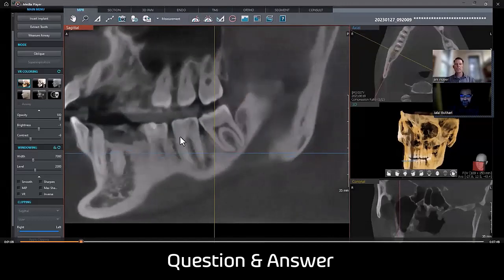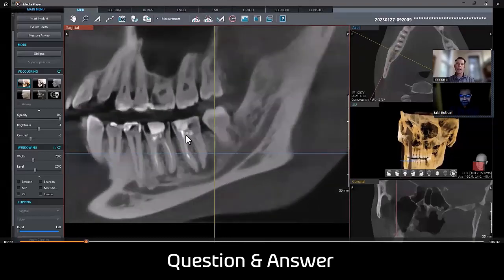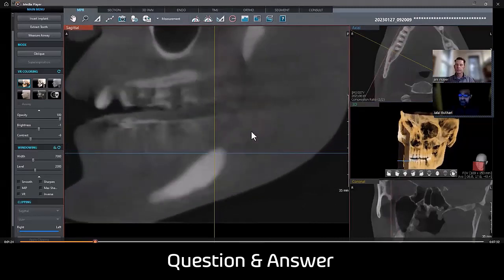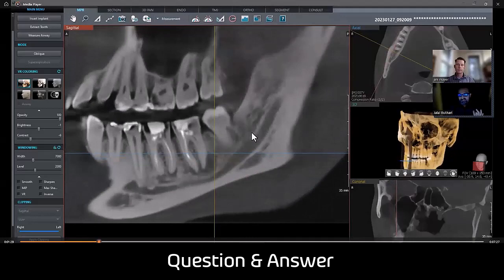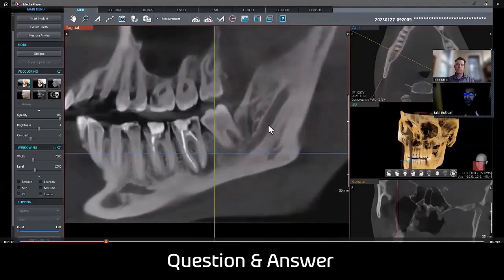And now we're basically scrolling back lateral medial across that to enhance those areas that you just talked about. So a lot of this is really just like we're targeting. When I do my trainings with doctors, we're targeting a certain area to enhance the image of the area of interest. Absolutely. You're utilizing the software to target a specific area to make the anatomy or some kind of pathology more clear in a certain slice.